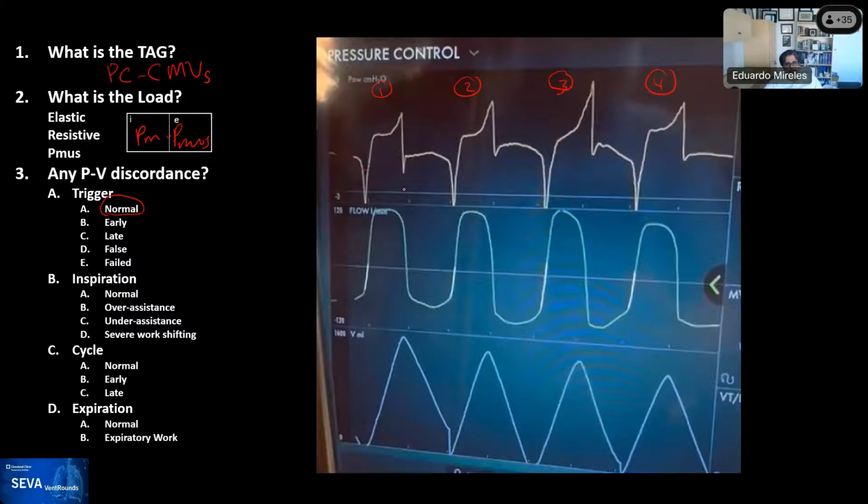But you can see the amount of effort being generated by the patient is actually increasing in depth from one to the other. You can see how from 1 to 2 to 3, it's actually dropping even below the second baseline that it's over here. So the patient is doing more and more effort. Yes, Mike, this is the same patient.